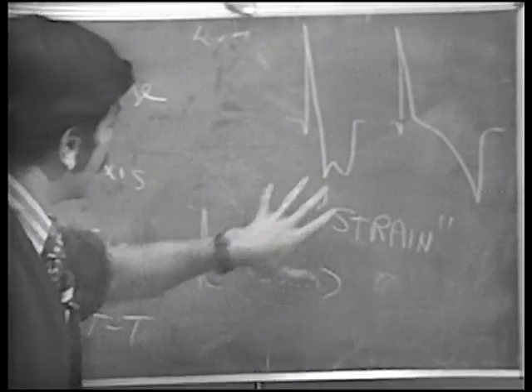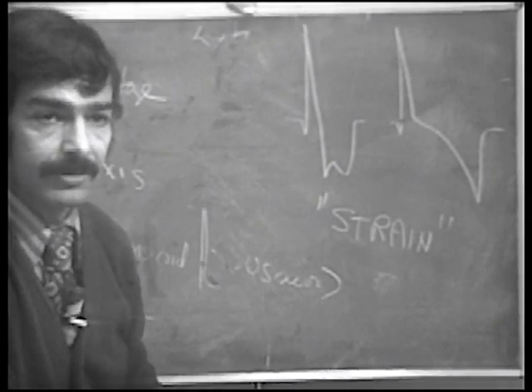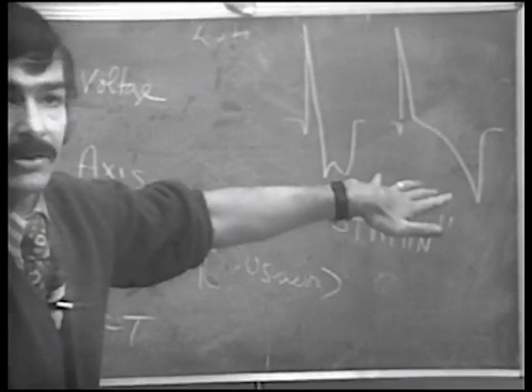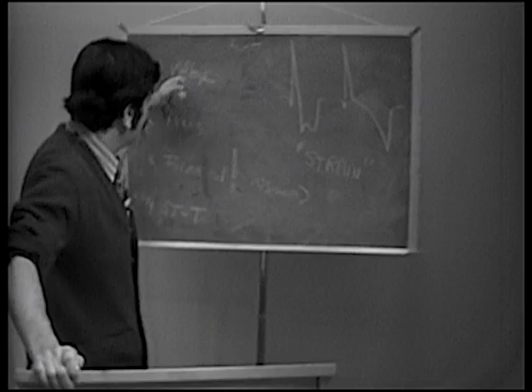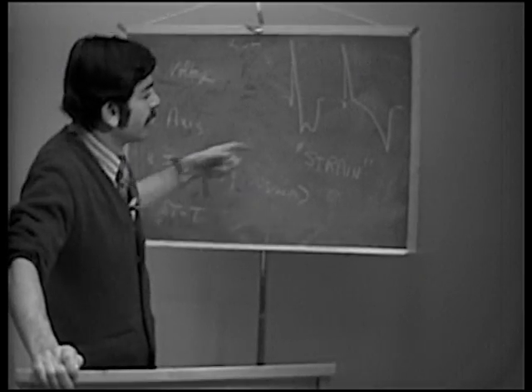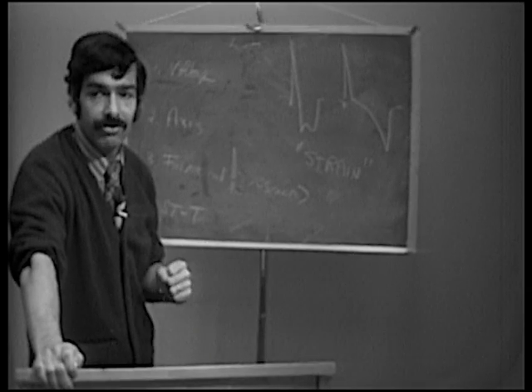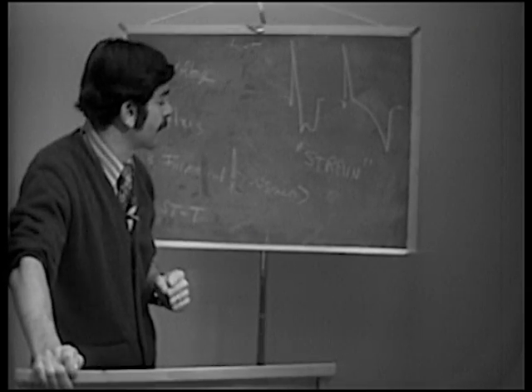Again, this pattern by itself, without any of the other signs of hypertrophy, does not really relate to hypertrophy. So you have to see other criteria for hypertrophy and then put this on top of it in order to establish its significance in ventricular hypertrophy.